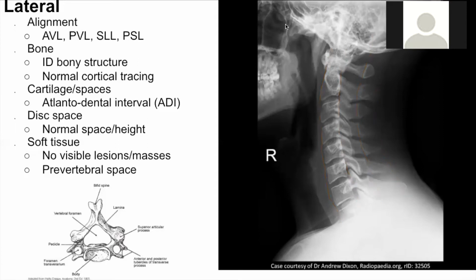So I want to go to this vertebra here in the bottom left, just to orient ourselves of where we are here: anterior, posterior, vertebral body, transverse process, pedicle, articular or lateral masses, lamina, and the spinous process. I'm sorry if you hear the dog in the background.